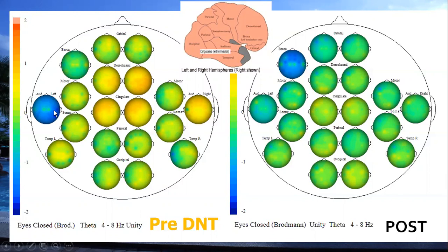Also, we got some stress markers here. You can see the left is using the verbal and physical stress marker. The right is the social and emotional one, and that one's really resolved. Sometimes it's not a stress marker, since the left can also be strong because you're very strong with language, but it is a stress marker if it's a case that we have to interpret and figure out from the person.